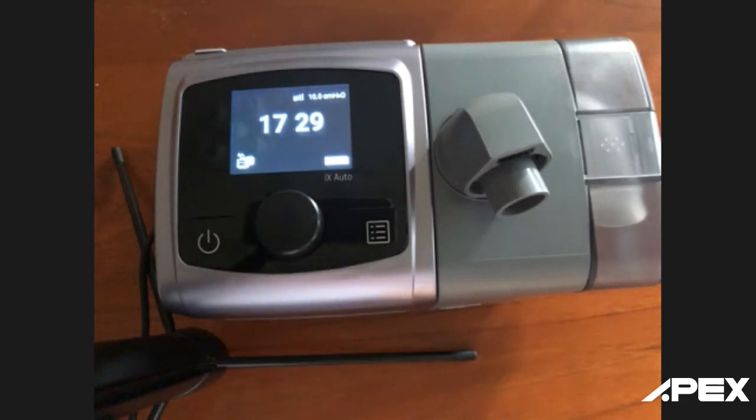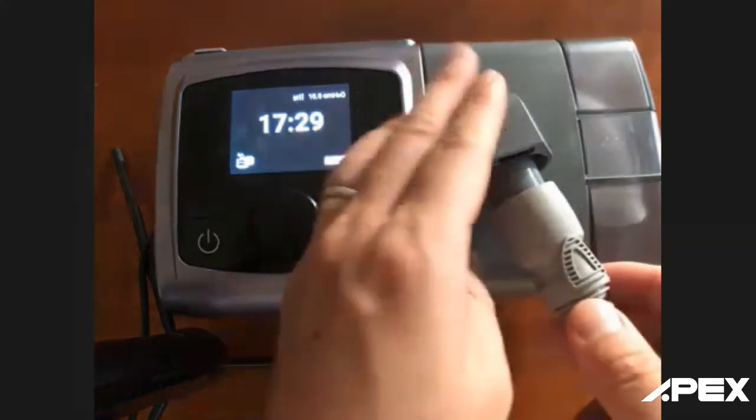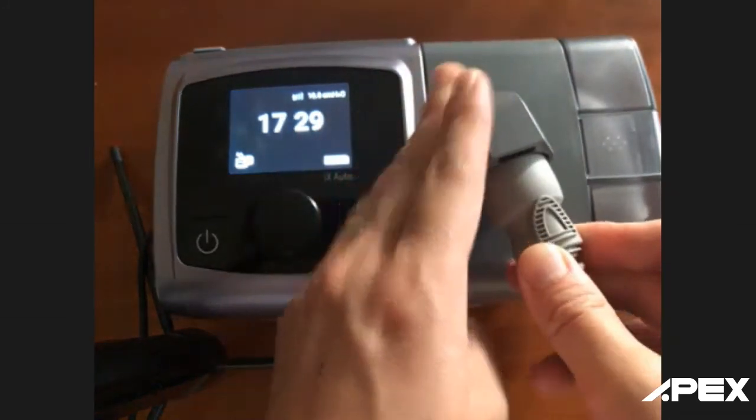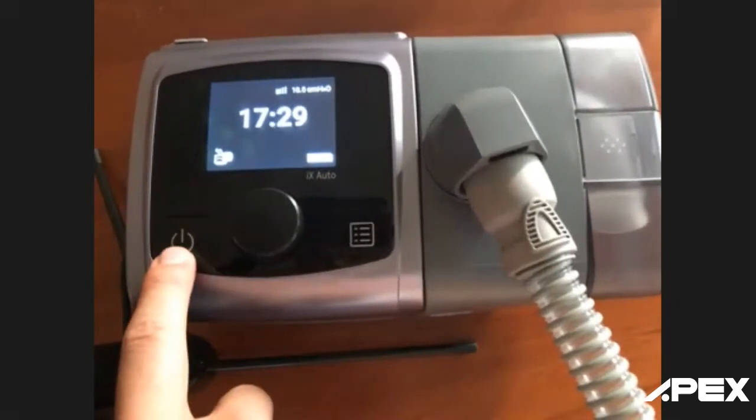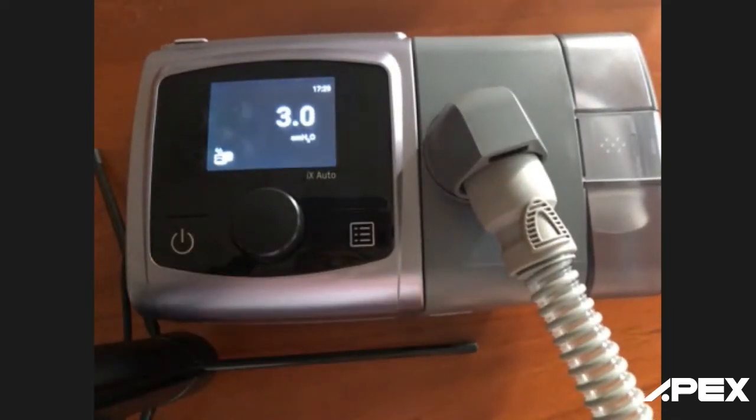Now, let me replug the air tubing back on. And then let me initiate the air pressure.